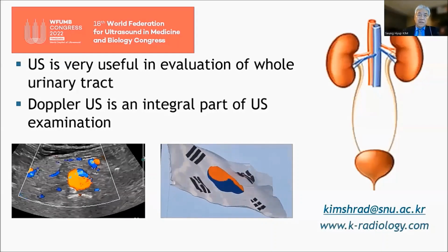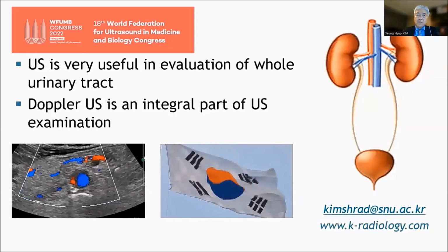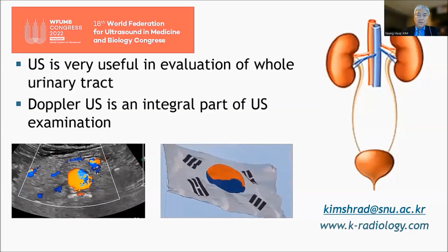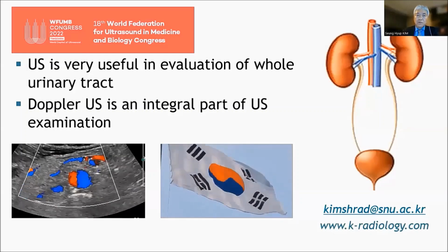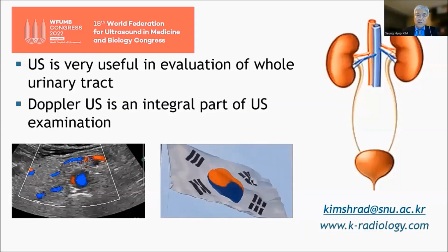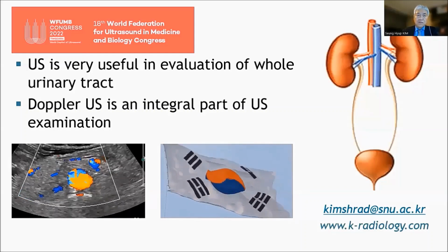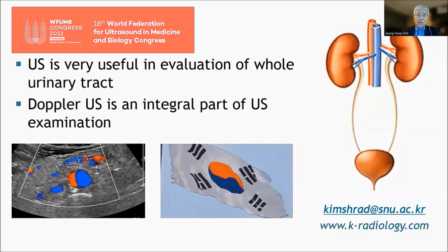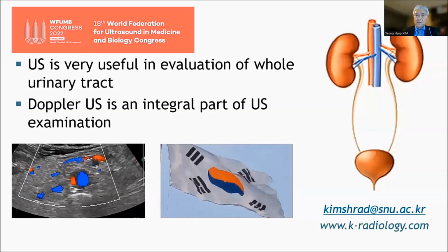This is the summary. I talked about how I do the ultrasound of the urinary tract from the kidney to the urinary bladder according to the items I described in the ultrasound report. The ultrasound is very useful in the evaluation of the whole urinary tract, and Doppler ultrasound is an integral part of the ultrasound examination.